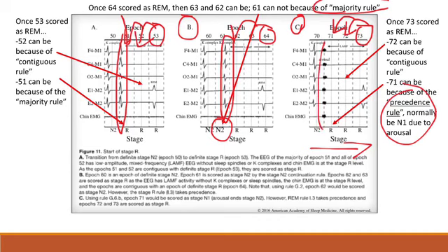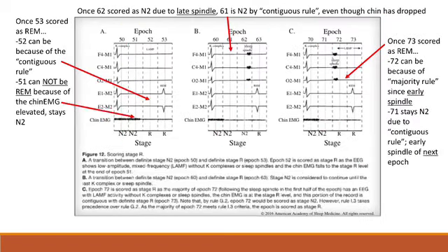You have an arousal right here. And then, of course, because you don't have rapid eye movements and you don't have K complexes, you probably would have kept it stage 1. But now that we go a couple of epochs down, the emphasis I'm trying to get here is that sometimes you have to go back 2 or 3 steps, 2 or 3 epochs, to rescore based off of new information.